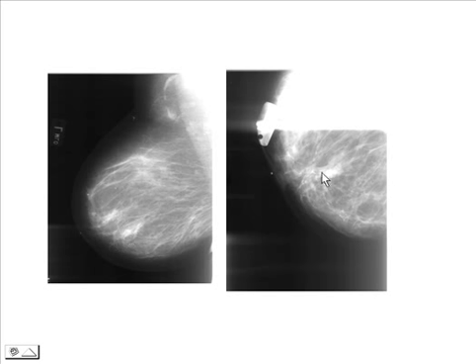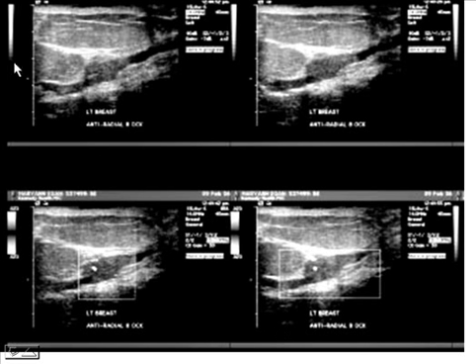We did a spot compression view. Makes it look a little less vague, but you still can't really characterize what this is. On the ultrasound, we can actually see in that area that this was a mass that was inside of a duct. You could actually delineate the entire duct and the mass within it. Now, just looking at it like this, you can't tell whether or not this is debris, solidified debris within a duct, or actually an intraductal mass.